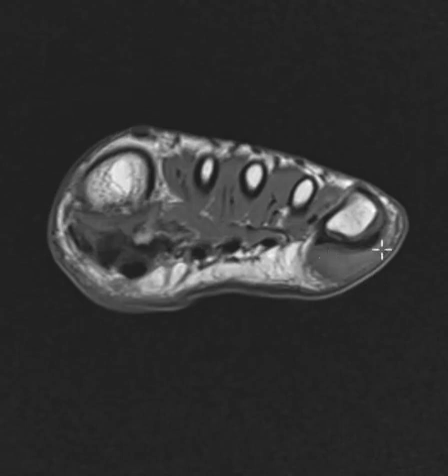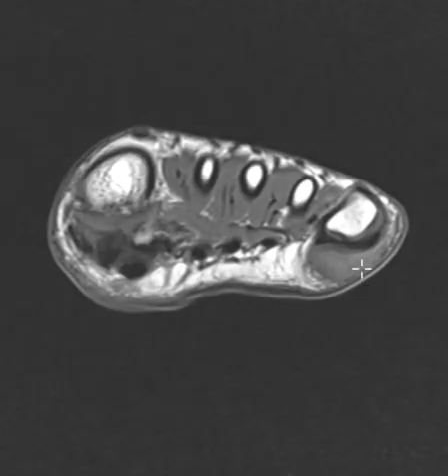When they have too much pressure over here, they get this reactive fibroblastic response in the soft tissues, and you get this mound. This is much bigger than usual. These are very common. You typically see them if you look for them along the lateral side or plantar side of the fifth. Sometimes the first metatarsal head beneath it will have a small pressure lesion, but we just call it a pressure lesion and throw it as an aside. And a lot of times people don't complain of these very much. We just notice them incidentally, but this one is much bigger than usual.